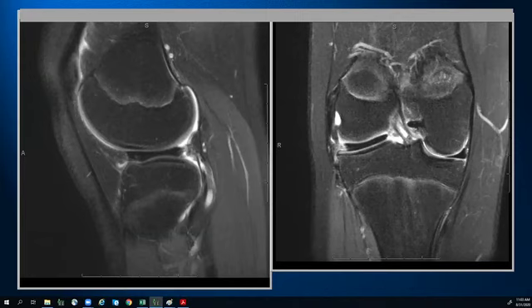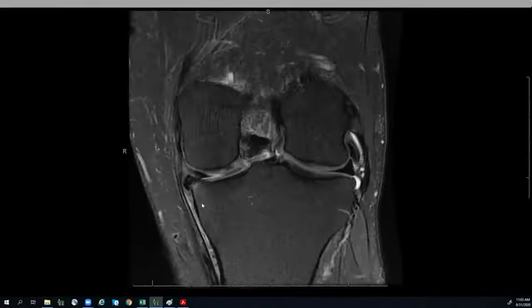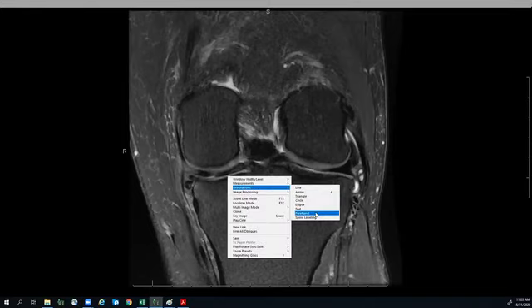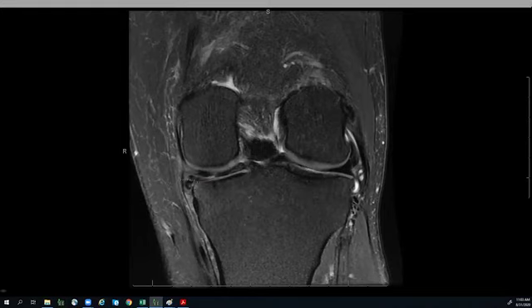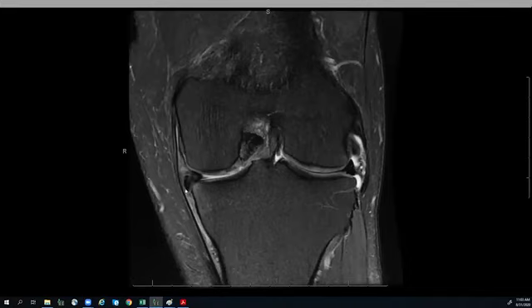David Payne is asking about the difference between a flap and a flipped tear. I will show one of my bonus examples of the flap tear to illustrate one of the points. With the meniscal flap tear, what winds up happening is you have a meniscal tear where the displaced fragment of meniscus gets displaced into one of the gutters. Whether it gets displaced into the inferior gutter or it's coming from the superior surface and gets displaced into the superior gutter, as you're panning around and looking at the meniscus body, you're going to see this bonus meniscal material either in the superior or inferior gutters.